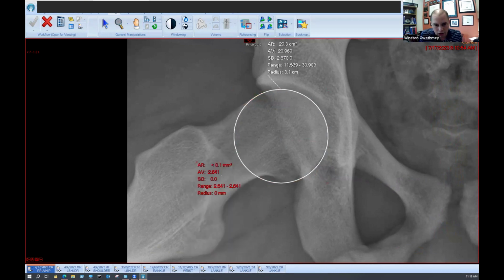In order to draw a femoral alpha angle, you can do a couple of things. One, you can make a second perfect fit circle on the femoral neck to get kind of an idea of where the center of your femoral neck is. Okay, so let's put this on the center of the femoral neck here, and we'll put this right here. So a double circle you can use in the tibia, you can use in the femur, you can use in the femoral neck here. This circle right here is going to be the center of the femoral neck.